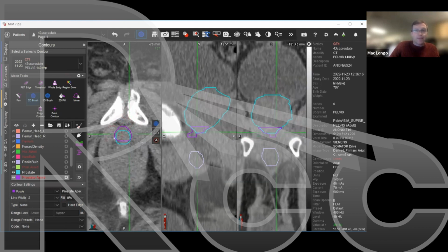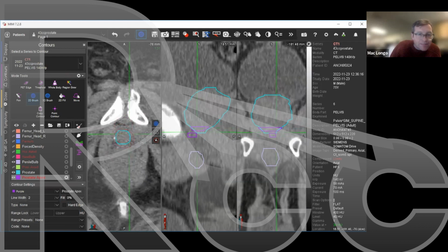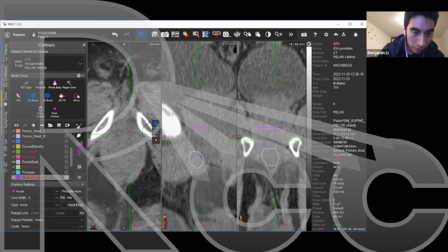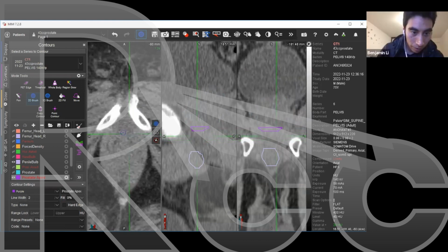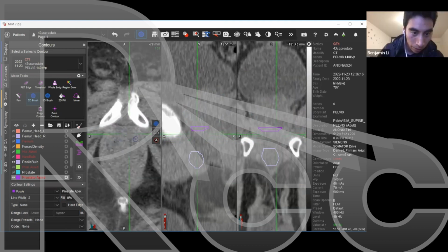But I think that's a good method on CT to help. Can we go down just to highlight the hourglass shape? I can try. Let me draw it with the annotate tool. I'm going to take these contours off. So here we're getting into the urethra right here. Here we can see, so here we're looking for something that's like this.